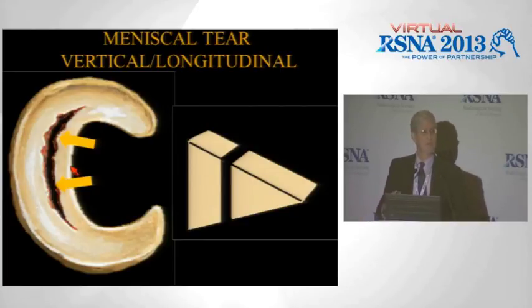So one of our most important roles is to not only identify tears, but to differentiate what kinds of tears, because that's what's really going to tell the surgeon what kind of surgery is going to be optimal. And they want to be able to warn the patient what kinds of surgical interventions are appropriate or are possible. It's different than 40 years ago. 40 years ago, they just took the meniscus out. I have a good friend who's a musculoskeletal radiologist that unfortunately had this happen 40 years ago, and he's having a total joint replacement in January because they just took out his meniscus.